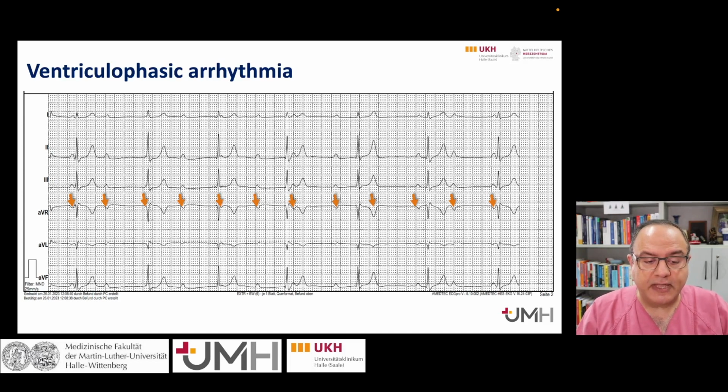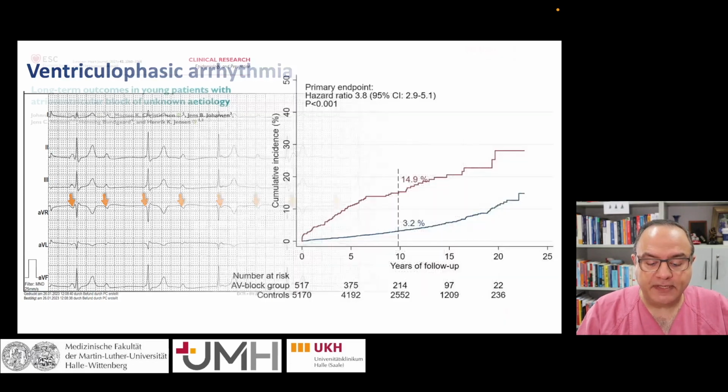Ventricular contraction elevates arterial blood pressure, which subsequently activates the arterial baroreceptors, and after that the vagal reflex slows the sinus rate and lengthens the PP interval without a QRS complex. So we can either explain it as a positive chronotropic effect of ventricular contraction or negative chronotropic effect of ventricular contraction, which finally results in ventriculophasic arrhythmia.